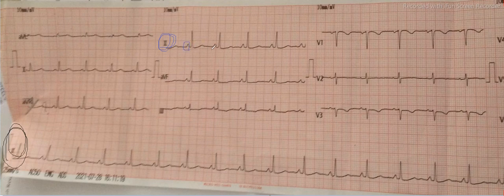In lead 2, the P wave must always be positive to be a normal ECG, a sinus rhythm ECG. So here you see in lead 2, the P waves are positive, so it is okay for us. And another thing you must understand is that for every QRS complex, a P wave must precede the QRS. So you see here in this rhythm strip, this is your P wave, this is your P wave, this is your P wave, this is your P wave.